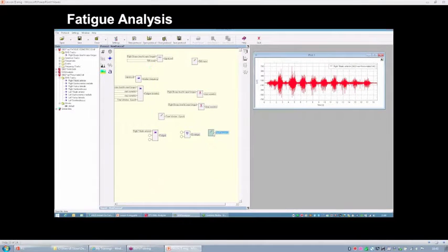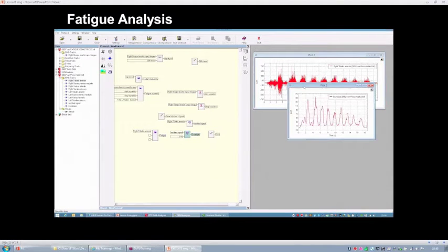I now set up the cutoff frequency. I'm going to choose 3 Hz. Remember that we have to rectify the signal before filtering. Okay, so this is the envelope.